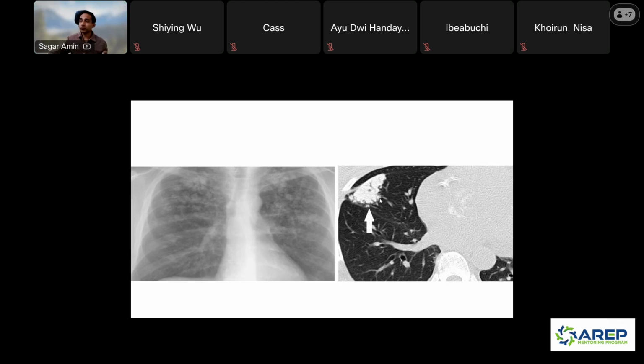All right, I'll give you a multiple choice. So one could be an infection. Two, it could be a vasculitis. Three, metastatic calcifications. Four, dendriform ossification. Any guesses? Well, if you're thinking of metastatic calcifications, you would be correct.